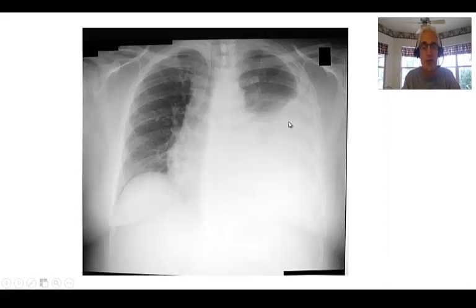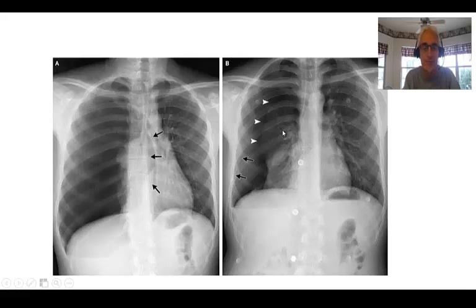This is a patient with a large effusion, the E. Look at this on the left side. There's an air fluid level right there. Big effusion caused by a cancer that's caused sweating, if you will, into the pleural space. Big pleural effusion. Now here's a patient who presents after a motor vehicle accident with shortness of breath.